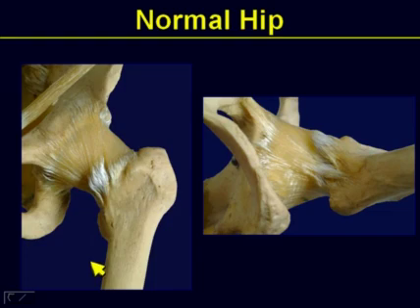We like to say sometimes en face. And then a profile, as you can see on the right-hand side. So on profile, albeit that the hip is covered by the fibrous tissue of the capsule, you begin to imagine again that you have to look at images on orthogonal planes, both in gross anatomy and of course in grayscale imaging.